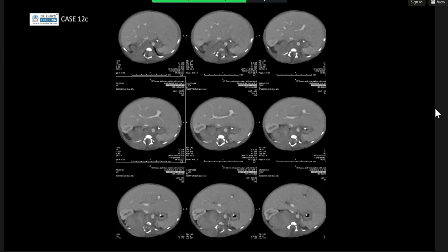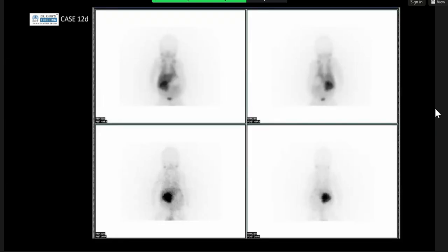Okay, so I've got a nuclear medicine scan as well. I think this is the MIBG scan. I could see the salivary glands and the heart, uptake in the heart and bilateral lungs. There is an MIBG avid lesion in the right paravertebral region, in favor of a neuroblastoma. However, there are no other distant metastases in this scan. Good. So this is a neuroblastoma.